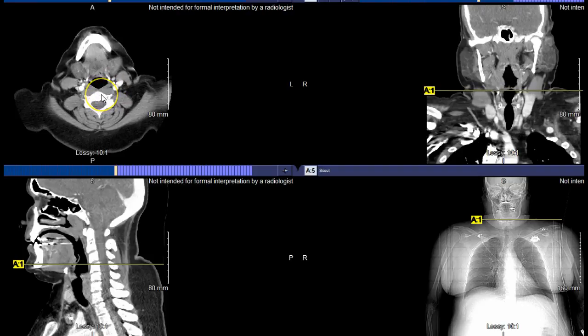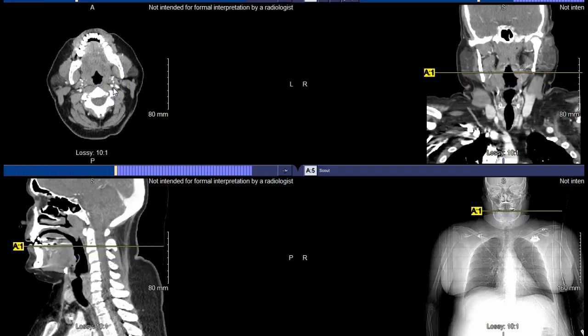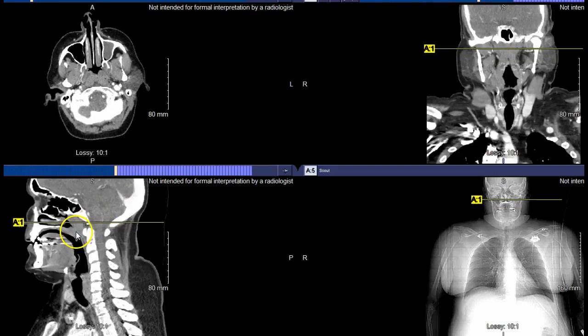So, a common slice for identification may look something like this, where you're identifying the vein and the carotids, and seeing which is which, respectively. In essence, those are the key structures that I really want you to know, but I will spend a little bit of time now going through the different orientations just so you can say, all right, I kind of get this.